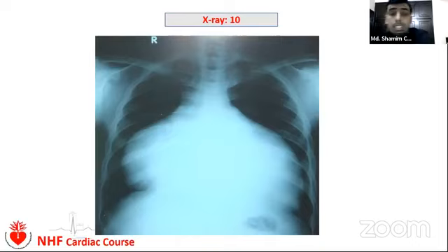Now, these are the last two X-rays of this type that students usually face in the exam, with huge cardiomegaly, oligemic lung fields with no vascular markings, and sharp borders. But look at the apex. The apex is not quite acute, both the angles are obtuse.